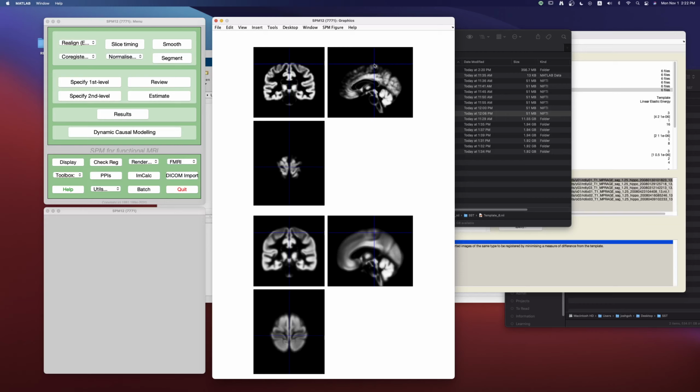All right, so this is the SST, which is the average of the 6 subjects we have, or the average of however many subjects you have in your setup. And this is the TPM. So we're not yet at MNI space, we're just in the SST space. And in the next step, we'll show you how to move from here to get all your subjects' EPI to the SST, and then from the SST to the MNI space.